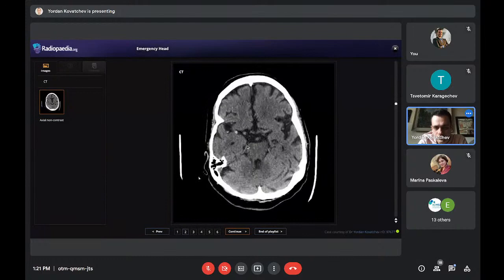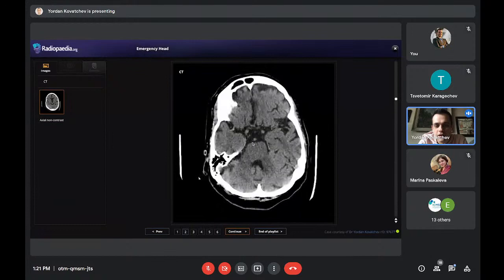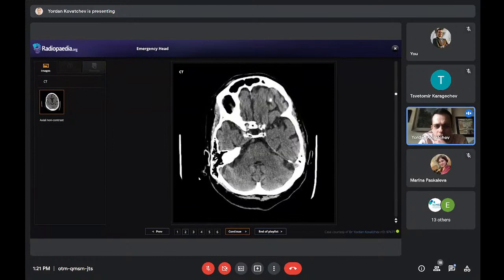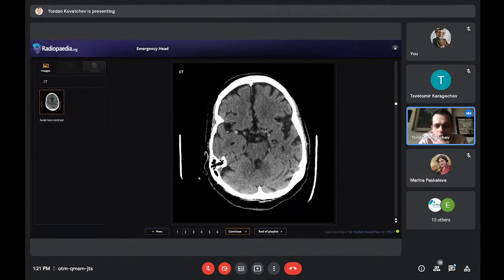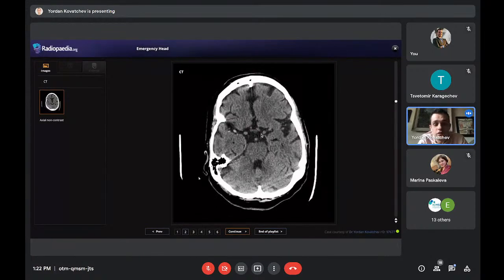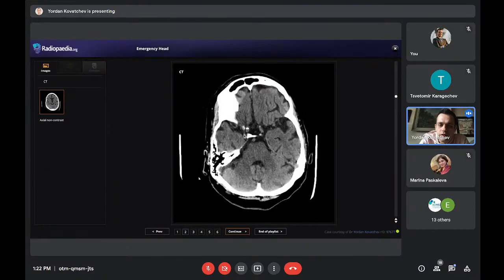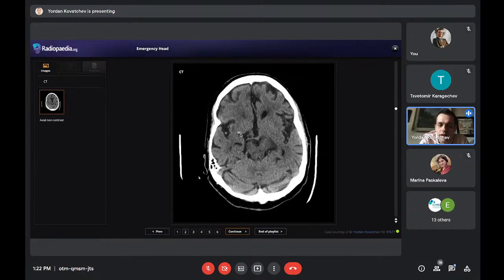And then we see this. I'm sure you notice it now because I really focused on it. Think about the arteries, the carotid artery coming inside, going as the middle cerebral artery on the left side. You can follow it with a density that's similar to the brain because we don't have contrast, surrounded by cerebrospinal fluid inside the basal cisterns, as you mentioned earlier, the circle of Willis. But on the right side, we see the internal carotid artery, and here it's already the middle cerebral artery in the M1 segment.